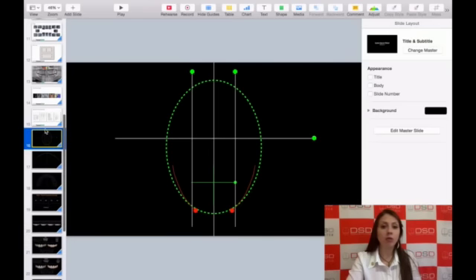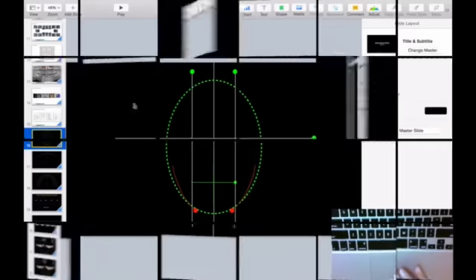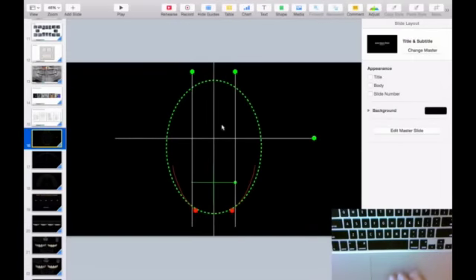So now what I'm going to do is I'm going to change my screens, and I'm going to show you my keyboard so you can see what I'm actually doing step by step. See you at the end. So there you go, now you can see my keyboard and what I'm going to do here to start our DSD.